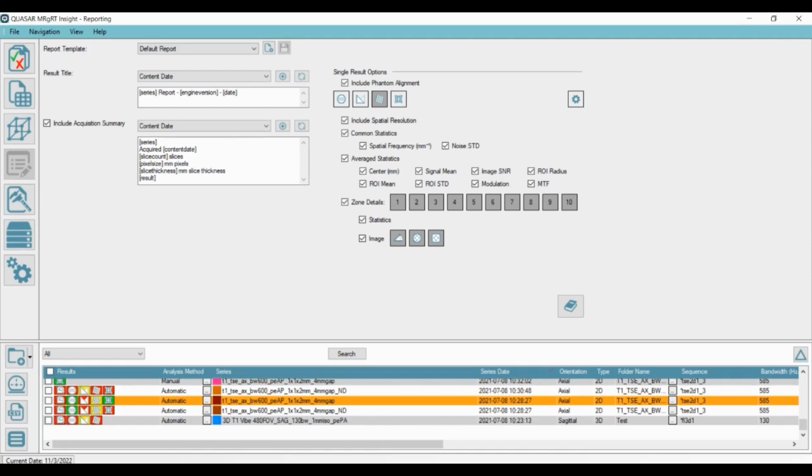So this will bring us to the reporting view, and it will provide the end user with a concise, streamlined way to export your system performance metrics in a customized PDF that could be saved or printed out for your records. And depending on what is needed for your site, there is also an option to include all the statistics that we saw before in it.